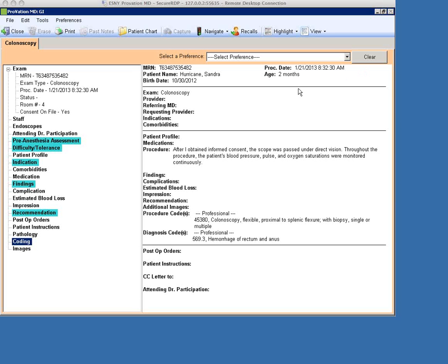Thank you for participating in this webinar on appropriate documentation utilizing the Provation EndoWriter system, with particular reference to the GIQuIC program. This is Dr. Brett Bernstein, Medical Director of Eastside Endoscopy and Director of Endoscopy at Beth Israel Medical Center.